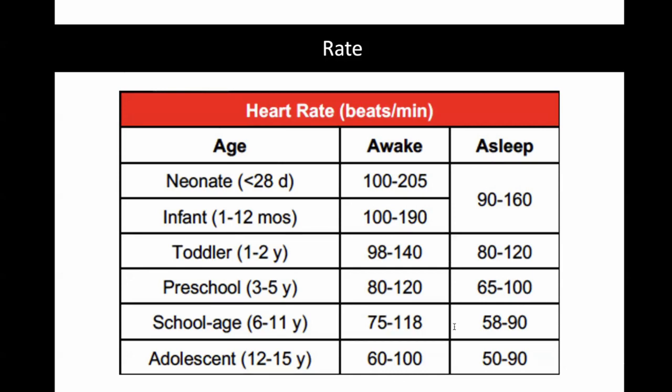Factors that should also be considered when interpreting the rate are whether the patient is awake, crying, sleeping, as well as if the patient appeared generally unwell, such as being febrile or is dehydrated during the time of the recording. The ECG machine automatically calculates the heart rate for you.